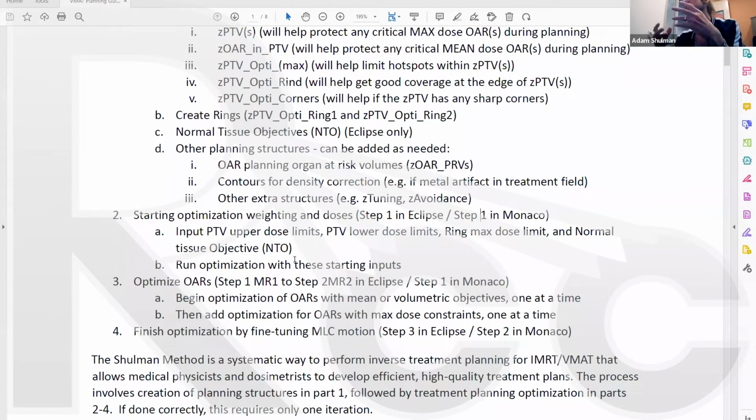So if all of a sudden at the end of your optimization, you decide, actually, I want to push dose in there, well, you're going to push dose in through the parotid, and it's going to give a big hot spot in the PTV, and you've messed up your whole process. You're no longer at a local minimum, and optimizing at that point does not work well. So you want coarse optimization at the beginning. Coarse optimization would be avoidance of these critical structures. You want a big coarse MLC closing along your brainstem. You want a big coarse MLC closing around your parotids.